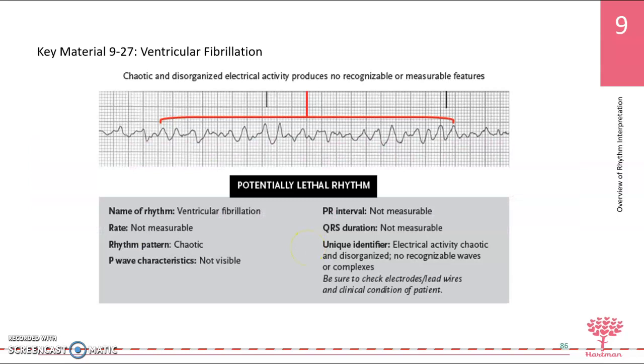Ventricular fibrillation. Fibrillation is a really fast rhythm, and there's basically no chance for it to create a normal rhythm, and so that's a good sign that they're in VFib. As you hear it referred to that a lot. This is what you're using the defibrillator for, the AED or the paddles. This is what you're using that for, to get them out of that, because remember, those things stop the heart so it can reset itself.